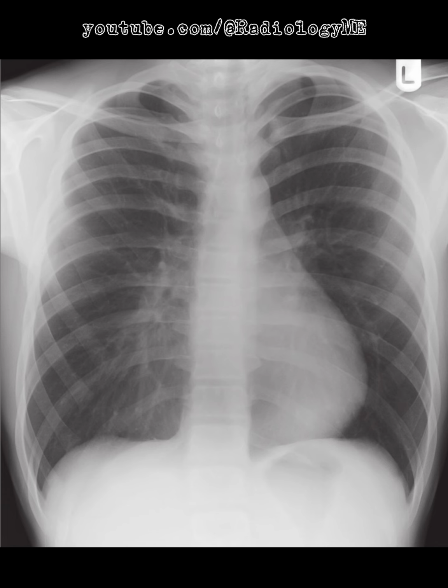Initially, that makes me wonder if there could be some underlying pathology in the right middle lobe, perhaps a consolidation or atelectasis. But before jumping to conclusions, it's essential to take a step back and consider the overall appearance. The lungs look pretty clear, without any obvious signs of focal consolidation or effusion, so that makes an active lung disease less likely. What's particularly notable, though, is the structure of the thoracic cage itself.